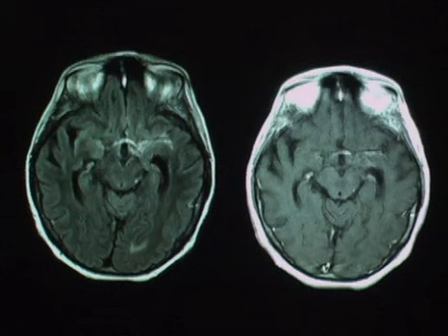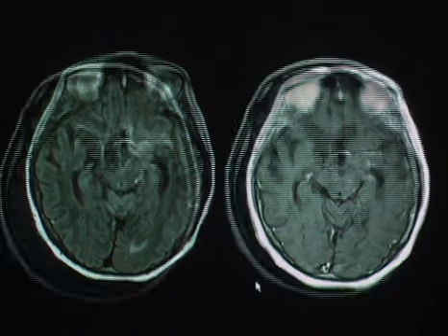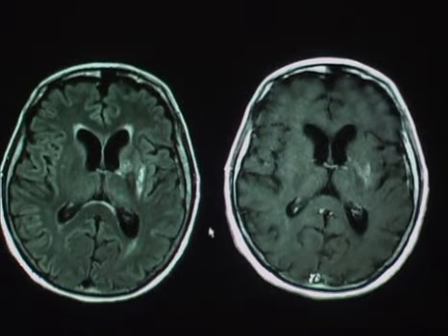this. So here's an example of tuberculous meningitis, and on a FLAIR-weighted imaging on the left, what we see is abnormal signal within the suprasellar cistern and the left middle cerebral artery cistern. This is seen in accompaniment with abnormal enhancement on the post-contrast imaging. This is the same patient, and what we see higher up is not only some mild ventricular dilatation compatible with a slight hydrocephalus, but we also see areas of enhancement involving the basal ganglia on the left, compatible with an associated extension of disease to form encephalitis, likely along the perforating vessels.